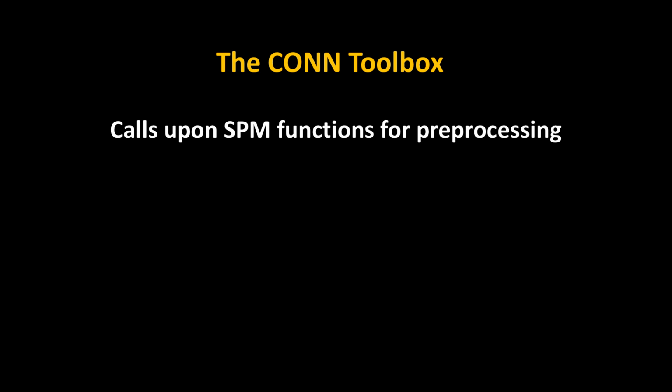It's so rewarding. Now the CONN toolbox, as I said, it's very self-contained, but they do call upon SPM functions for pre-processing, which is why you need SPM installed. So anything you do with SPM to analyze task data or anything you've done in SPM, it's going to be calling upon the same thing. So SPM realign, SPM normalize, SPM smooth, all of that it's going to use.